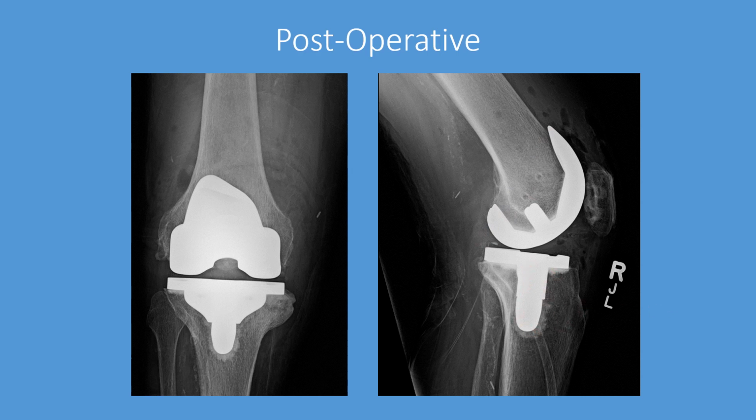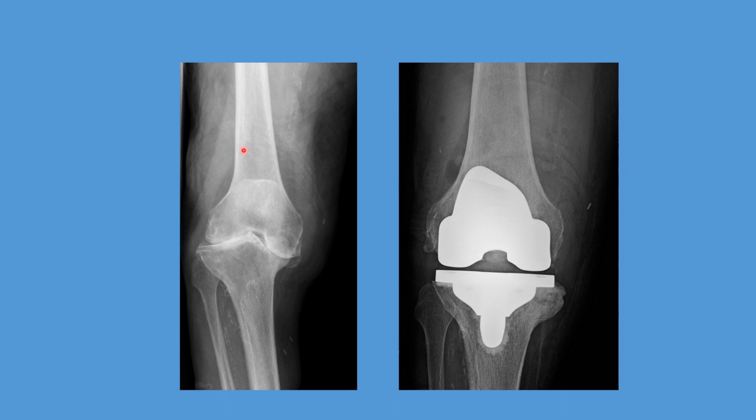And then let's take a look and see where we were. So this is where we were prior to surgery. Femur, tibia, completely bone on bone, medial tibial collapse, and then subluxation. You can see now we've restored a separation so there can be transfer of load between the bones without the bones grinding. We've restored the medial tibia support where it was absent before, and we've corrected alignment. So now femur and tibia are lined up, and the tibia is no longer subluxed.